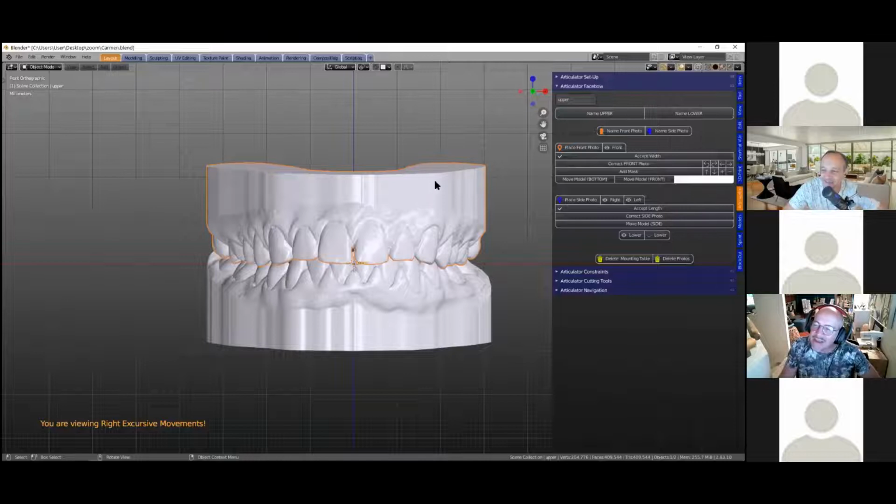So again, we're going to name these models. If they are named before, which they are at the moment, please just click these buttons because there's scripting behind it, which we need. So that sets the algorithms into motion by pressing those buttons? Yes, exactly. And I'll show you exactly why.